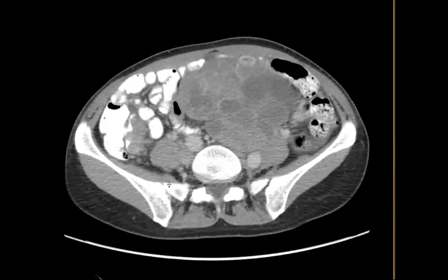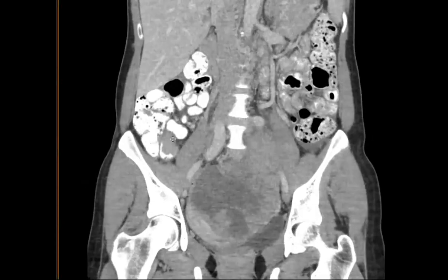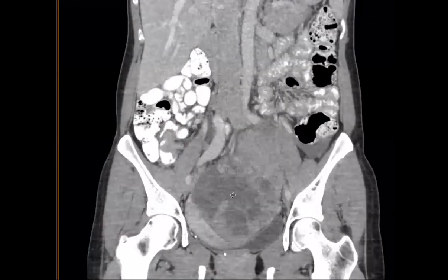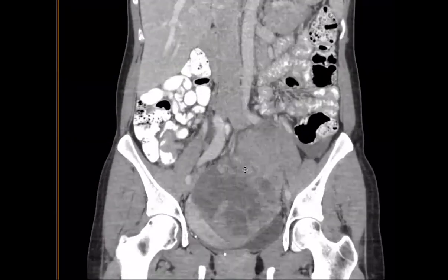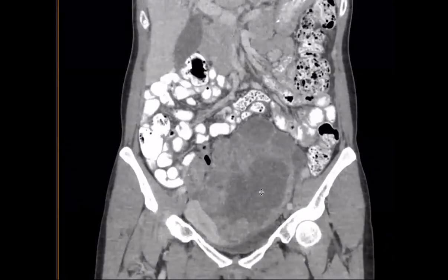And there is another finding in this image. Like a colonic mass? Exactly. Along the cecum, you see this polypoid mass, and this is what it looks like in the coronal plane. So this turned out to be a colonic primary with bilateral ovarian mets. Just another teaching point along similar lines: do not stop with satisfaction of search, look around, especially in a young woman when there are bilateral ovarian masses. 5 to 10% can be metastases, and the usual suspects are either appendix or colon, endometrium, and then of course gastric.